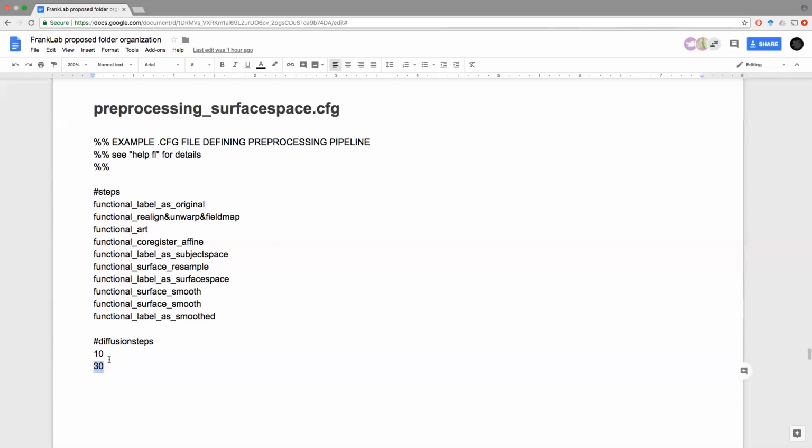In general, the full level of smoothing is what I would recommend as the default. If I were to change this to only have one level of smoothing, I would strongly recommend using the final version of it, so basically the fully smoothed data.